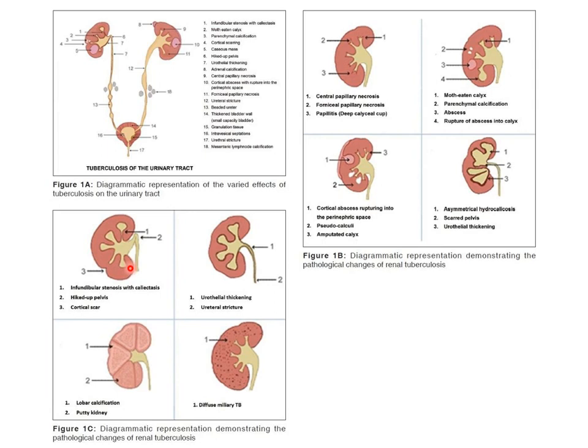cortical granuloma formation, which either bursts to the outside causing abscess formation, or causes cavitation. And this abscess either bursts to the outside into the retroperitoneum, or bursts into the infundibulum. And at the end stage of TB, the kidney will shrink and decrease in size, autonephrectomy, not functioning, with no excretion of contrast, and containing dystrophic calcification. And this is the involvement of the kidney.